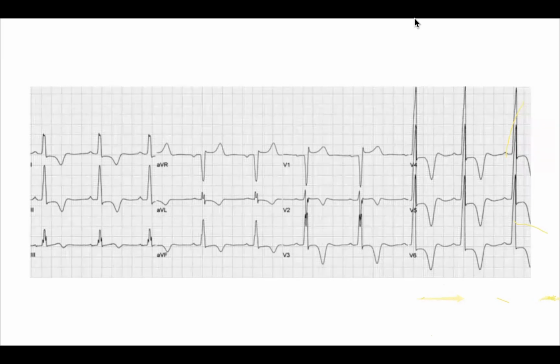Why should you know? Because they have a high risk of sudden cardiac death. So if they ask, what is a salient point you ask in the history? They have given that the patient is having syncope. If I see this ECG, one thing I will ask is whether the patient had syncopal episodes. That shows the patient might have had some hemodynamically unstable VT and a fall.